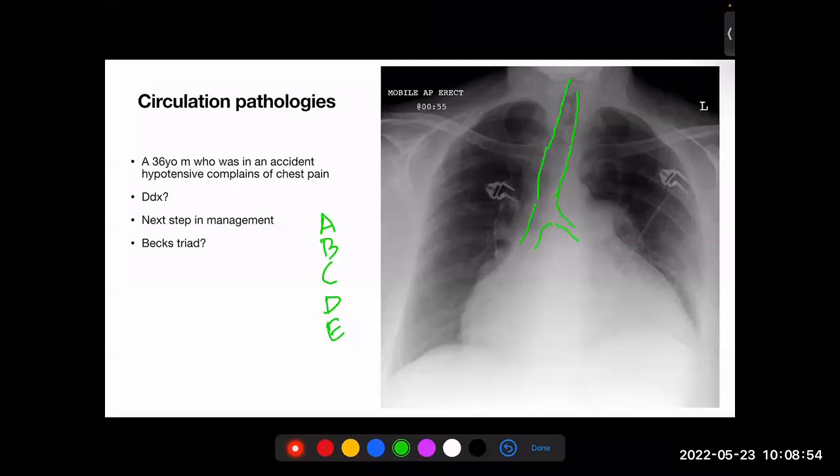There is deviation. Stop looking at the big things and forgetting the small things. Moving on. So the tracheal deviation we have agreed. Look at the lungs. Come up here. There is some opacification, but nothing really huge. This side also, come this way. There's some opacification down here, but okay.